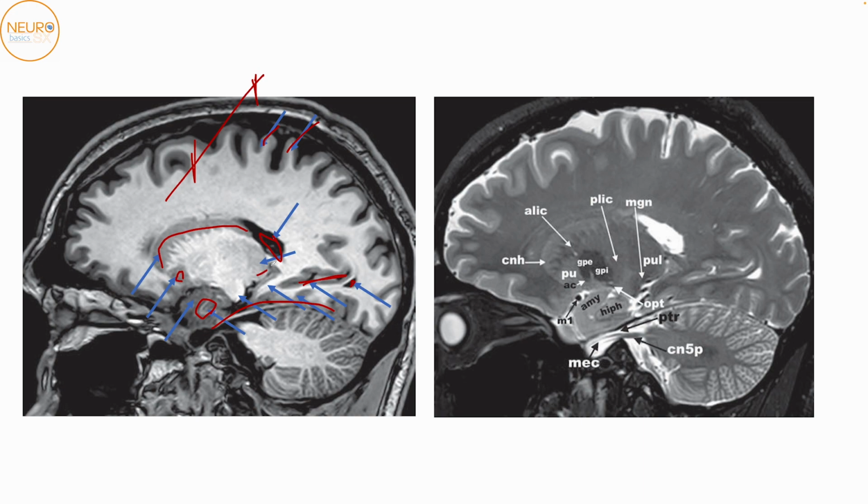This other area of grey matter is the pulvinar of the thalamus. So in this cut, we're able to make out the caudate, the putamen, and the thalamus over here, the amygdala, the pre and the post-central gyrus.